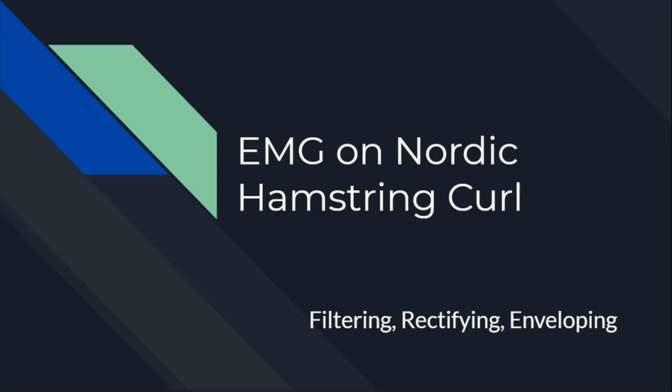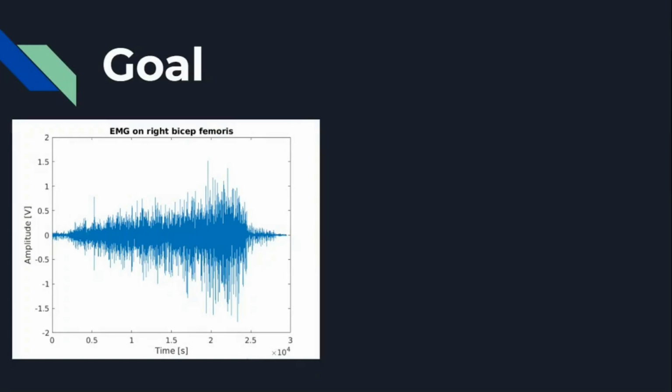Today I'm gonna show you how to analyze the data of EMG on Nordic Hamstring curl. Especially I'm gonna show you how to do filtering, rectifying, and enveloping the data. So the goal of this YouTube video is to analyze the data of EMG.